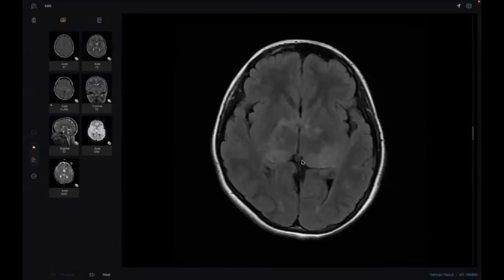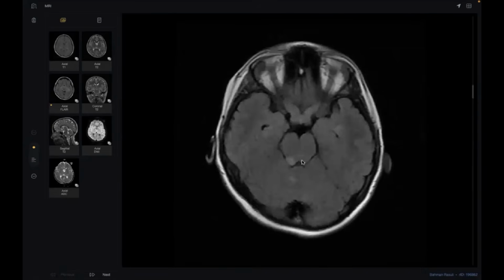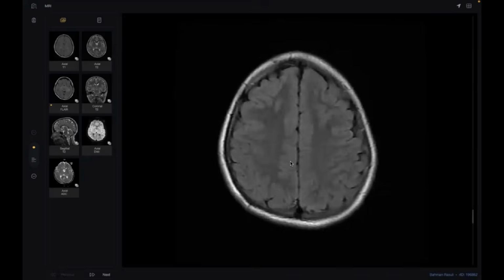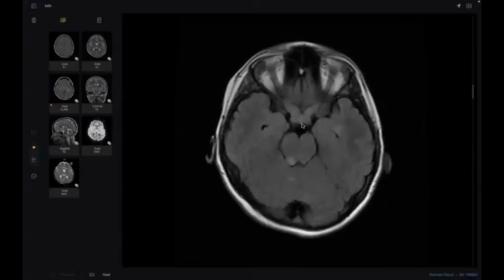There are multiple scattered basal ganglia, midbrain and posterior cerebellar signal abnormalities, some of them expanded, with high T2 and FLAIR. Don't talk and talk and talk about the same area, because you will not get a proper diagnosis. What should you do? Look subcortical, look subependymal, look at the orbit. You must find something in these three areas to diagnose any phakomatosis.